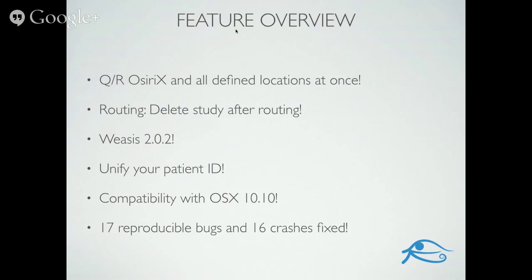OsiriX 6.0 introduces the latest version of Weasis, 2.0.2. We'll show you briefly how to set up the web viewer and use the Weasis application. You can now unify patient IDs. So if a study is imported from a CD that's come from an outpatient radiology practice, possibly, and you have studies in your image archive that are the same patient but different demographic information, perhaps medical record number is different, date of birth is different, you can now unify those.